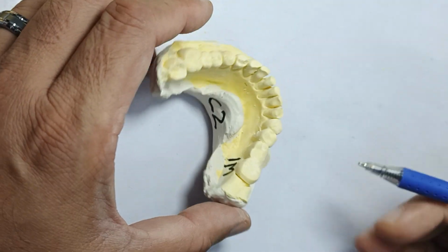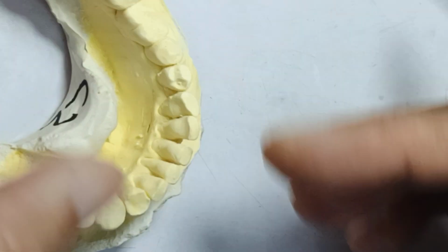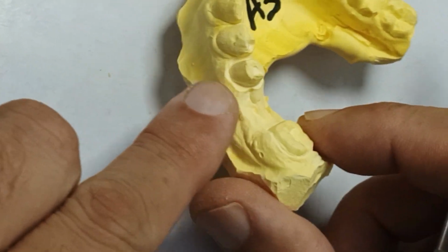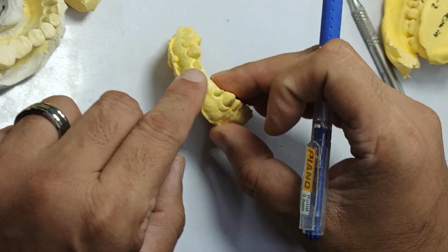Look, somebody has done this too. This is kind of bridge. There's no anatomy right there, none whatsoever. Tooth is sunk in. This is a model. Now look at this prep right there. Same thing. You cannot see the margins anywhere. What kind of prep has been done? We do not know. We have example after example after example. Another bridge right there.